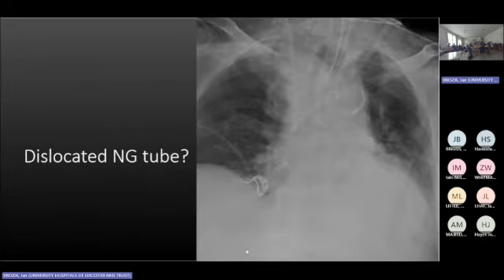So now I would like to make it a bit more interactive. I showed this image in another meeting, so some of you might already remember it. I know this is not a great visualization, but my query is, if you strictly adhere to our guidelines about NG tube, are you happy?